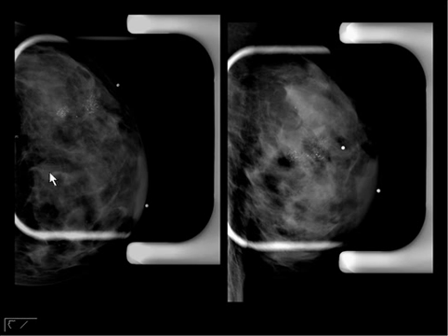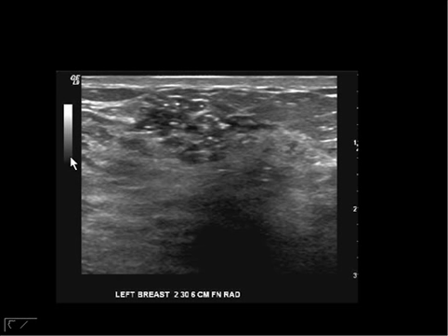And in the case of extensive calcifications such as these, we are likely to see the calcifications on the ultrasound. We aren't in the business yet of looking for calcifications on ultrasound, but when you see a fair region, chances are with high-resolution equipment, you are going to see those calcifications within this region of ducts on the ultrasound. So we use the ultrasound as a guide for biopsy, which was much easier than either doing it on the mammogram or using MRI.